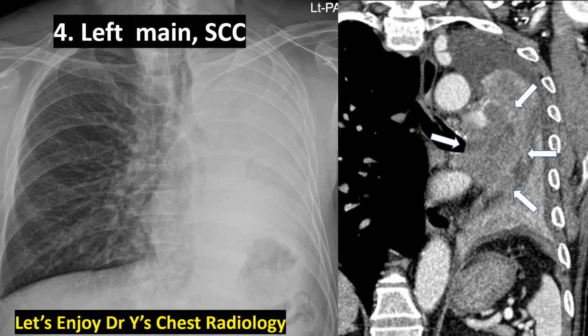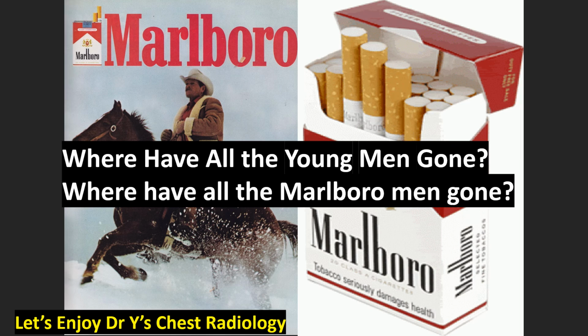The coronal contrast enhanced CT film shows us the arrows are telling us the extent of the tumor and the more peripheral portion of lung collapsed, surrounded by left pleural effusion, mediastinal shift to the left, diaphragmatic shift upward. Yes, all suggest tumor with total collapse of the left lung and volume decrease on the left side, squamous cell carcinoma in the left main bronchus.